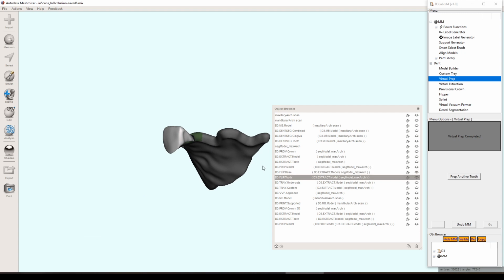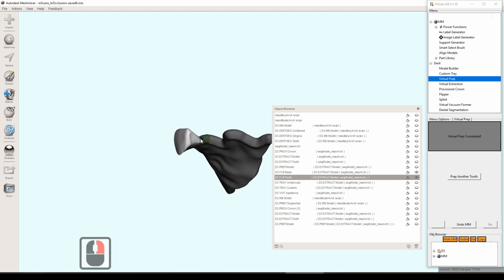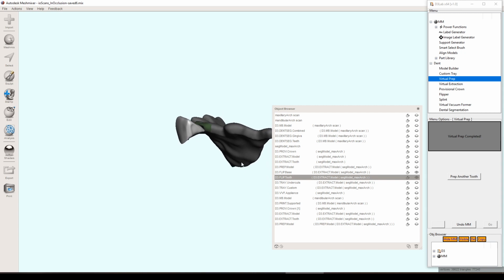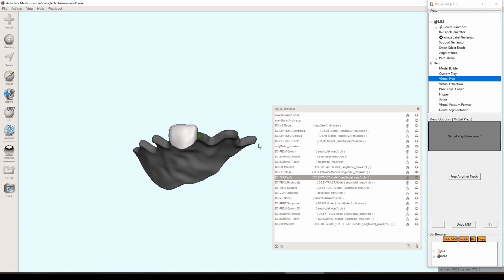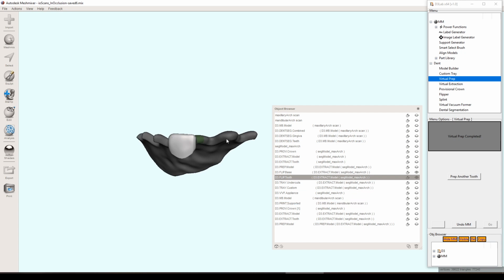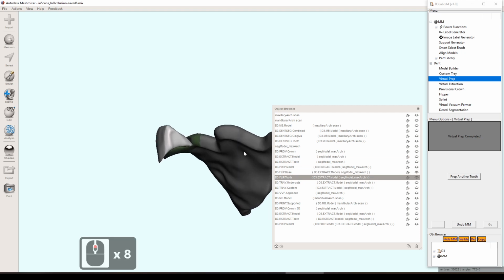The reason I did this is because companies like Formlabs are coming out with the denture tooth and denture base resin, so you're going to have to print those things out in 2 separate pieces. Now, arguably, this could and should be printed out in just 1 piece, especially if you're just doing the lingual. If you did it all in the tooth color, who would know the difference? It's probably easier, and I probably should have done it that way to begin with, but still, it generates 2 separate pieces, the tooth and the base. And from this point, I feel like it's fairly trivial, if you know what you're doing, to combine these 2 things together, and then you could just have the 1 piece if you wanted.